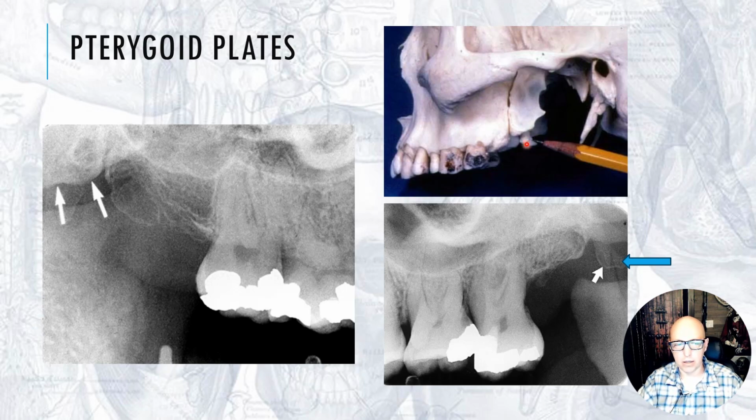Some little hook-shaped thing that extends distally. Probably that's what you're seeing right there as well. This is the hamulus, and it extends off the medial pterygoid plate. So if you can see there, it kind of attaches more medial. It's the hamulus. It's rare to see that in a radiograph, so always exciting when you see a hamulus.